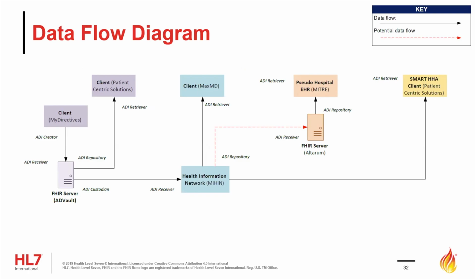You'll see that it starts with the creation of the information that'll be put into a server that'll then be viewed by a client and then also sent to another server where that information will be able to be retrieved by individuals and then used throughout the continuum of the story. What we'll do now is go into each detail specific for the patient and walk you through the patient scenario.